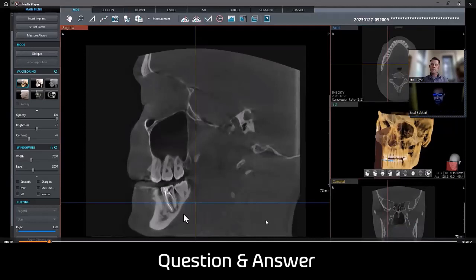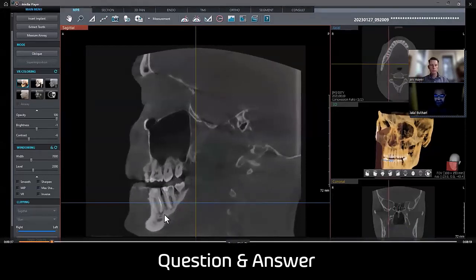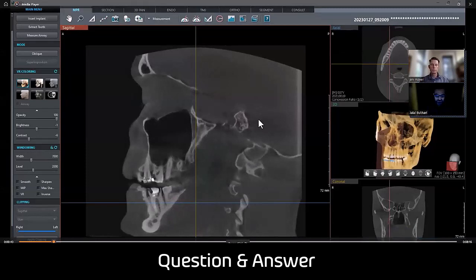For example, you can look at the sagittal section right in front of us, and this is what we call a bone window, so you only see osseous structures. But the software gives you the capabilities to make some features seem more apparent. If you want to highlight certain areas, it'll let you do that, and it's such a great tool. So right now, as we're scrolling through the software, you can only see bony structures at this time.